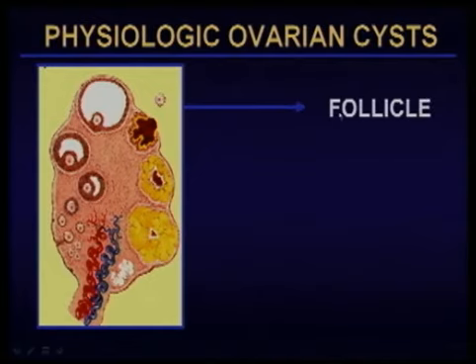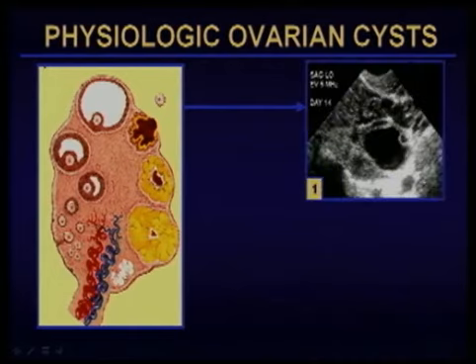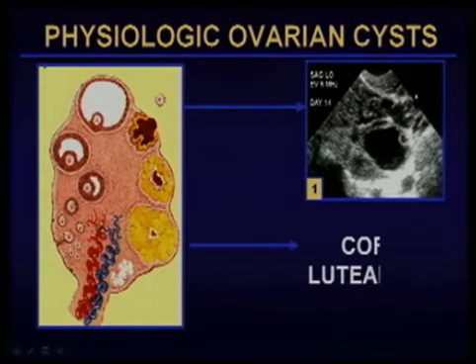And I know that follicles become their largest just prior to ovulation. They can become as large as 30 millimeters, and they're associated with estrogen production. And here we have case number 1 on day 14 showing a follicle with a little cumulus. So how do I report this? Well, this is a normal finding for this woman. We'll talk about in a minute a recently published consensus as to how we should address this situation.